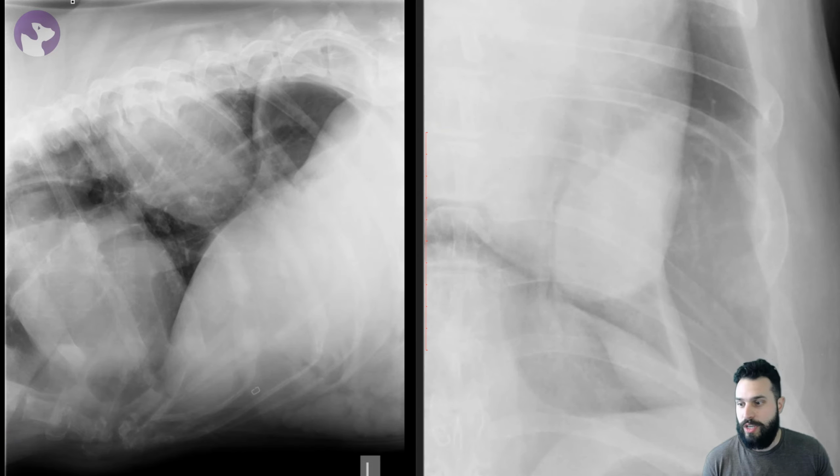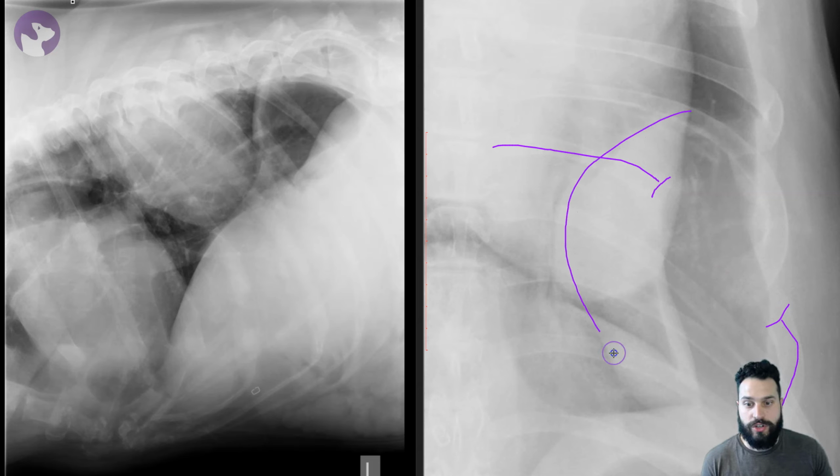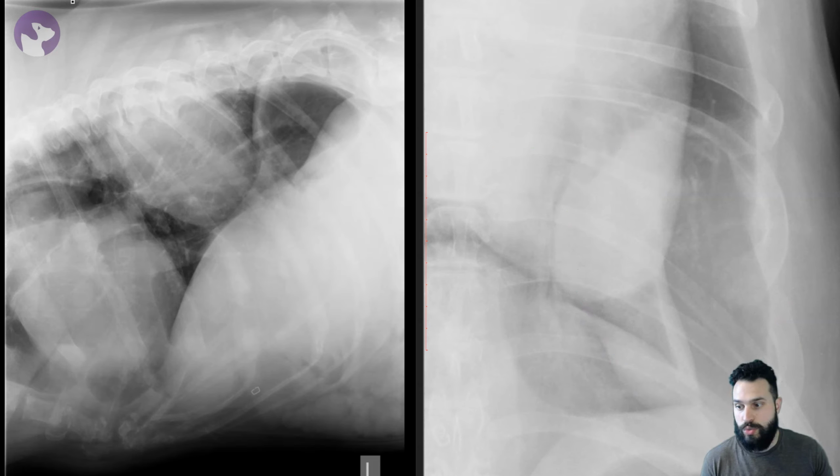So if we look here, what we're seeing is that the rib comes down and then is actually truncated a little bit before we're catching that rib again more distally. So between here and here, there's actually no rib that we're able to see, and there's this large soft tissue mass occupying that region. So what we're seeing there is rib lysis associated with this rib-associated neoplasm.